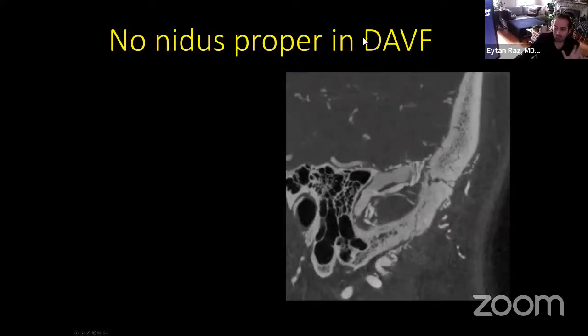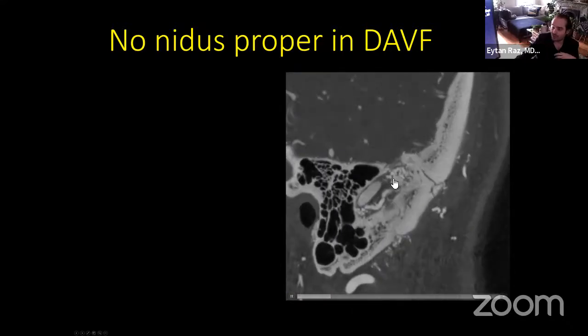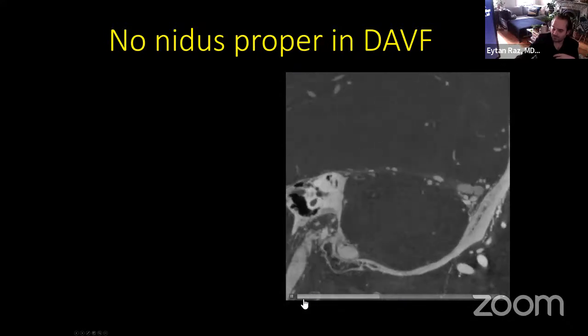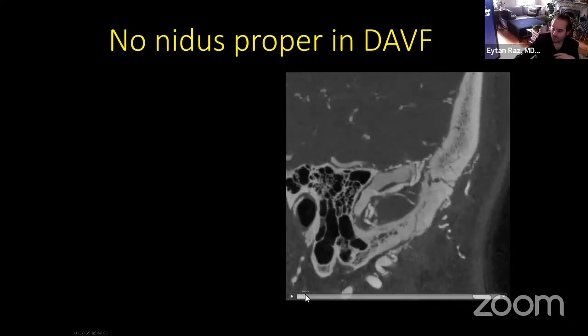Now, in a dural AV fistula, we believe there's no nidus proper, differently than a brain AVM. But sometimes there are some vessels that really look like a nidus. Why? Because essentially they are convergence of arteries that converge all the way, and then connect with the vein. And this is an example. This is a DynaCT that shows this very well.